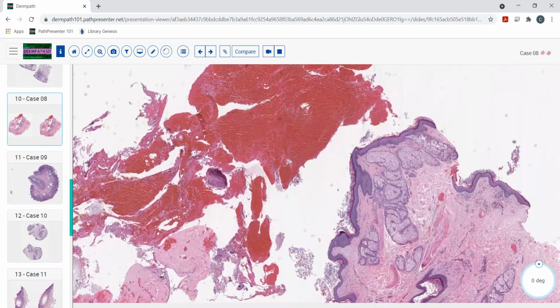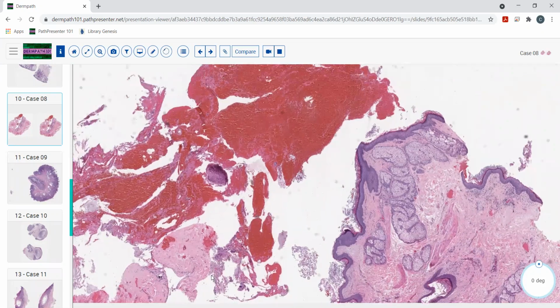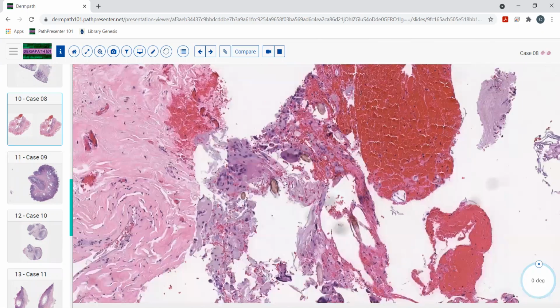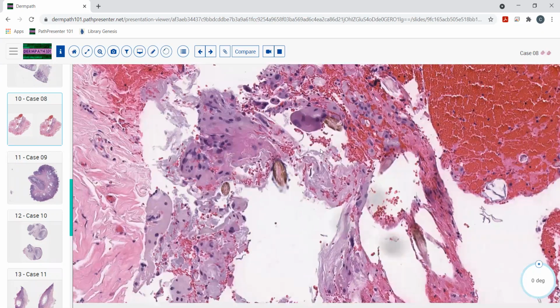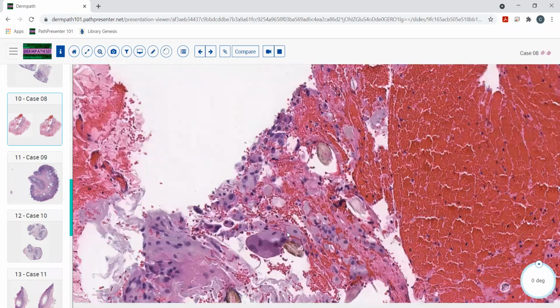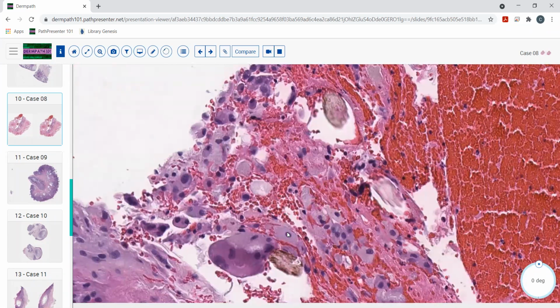Sometimes you'll see other elements in a dermoid. Very commonly, and here you've actually got some of the hair shafts within them. You've got some, possibly, these are macrophages that look like they've maybe engulfed some proteinaceous material, so there might even be an eccrine or an apocrine component to these. But it's not the same as a vellus hair cyst, because a vellus hair cyst has that very thin lining.